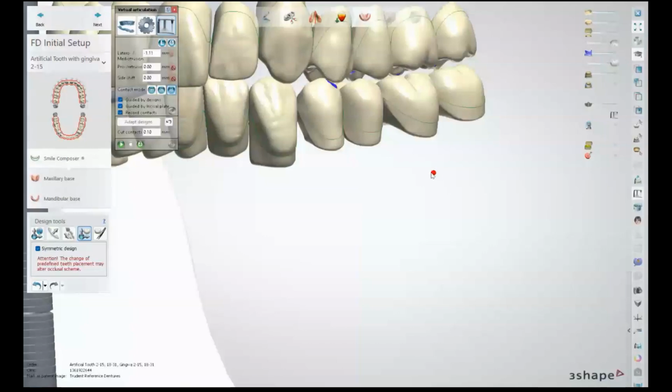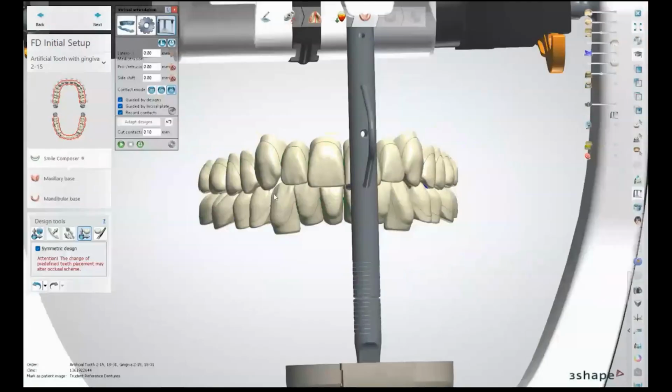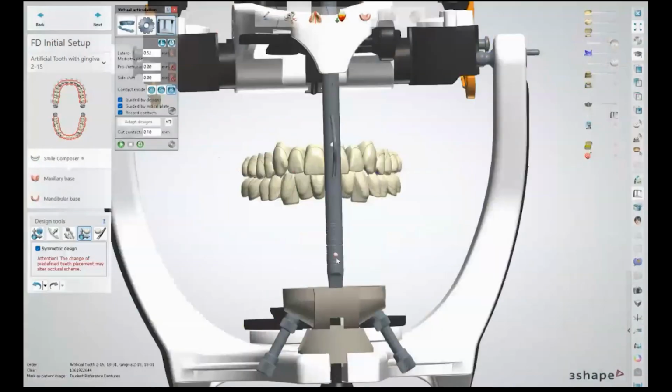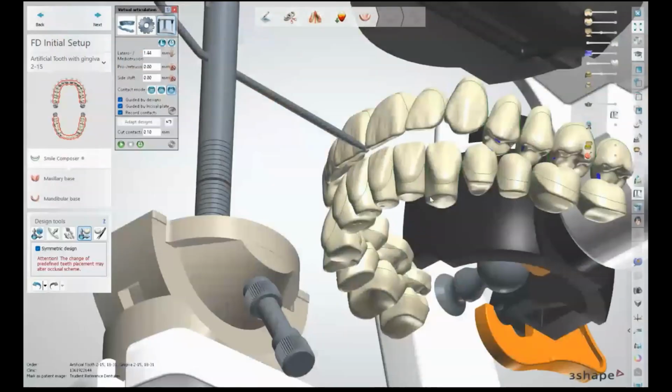So I'm going to go up to the box and reset. So here, right under that articulator icon, a little circled arrow here that we're going to hit, and that will reset it to centric. And now I'm just going to go to the opposite side. And I'm going to look at that function and make sure that I'm getting the markings everywhere as well. So everything looks good. So my lateral excursions look really good.